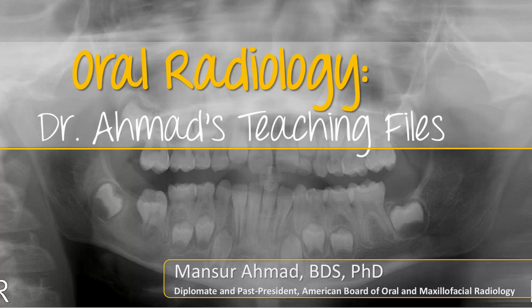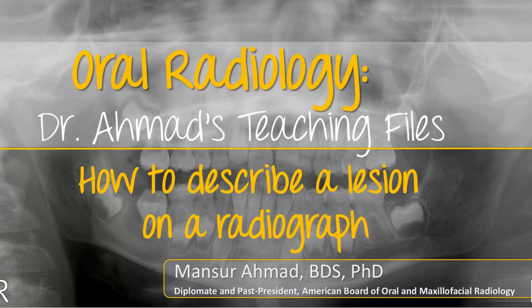I bring to you selected cases from my collection of thousands of interesting radiographs. These are cases that will help you improve your diagnostic skill. Some of these cases are easier to interpret. Some are, I guess, rather challenging. But every case will have something for you. This video contains basic information on radiographic interpretation. That is, how do you describe a lesion that you see on a radiograph?